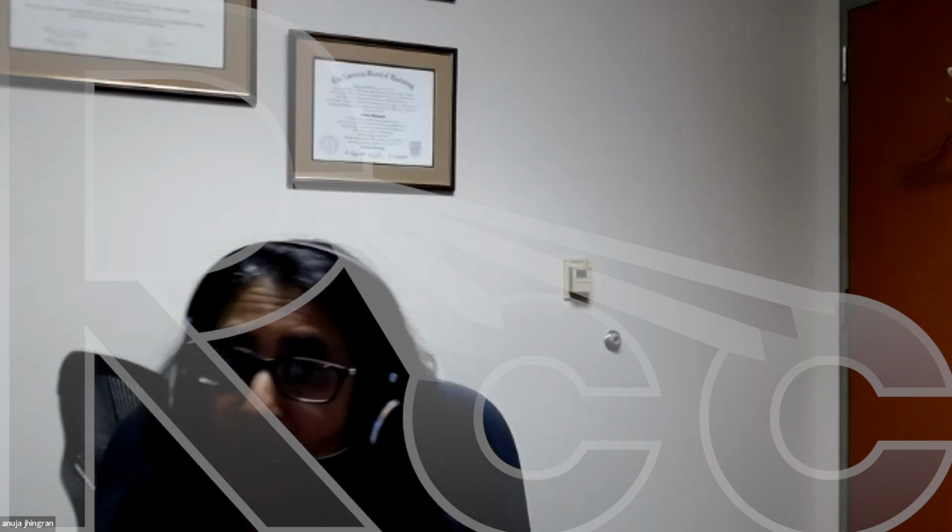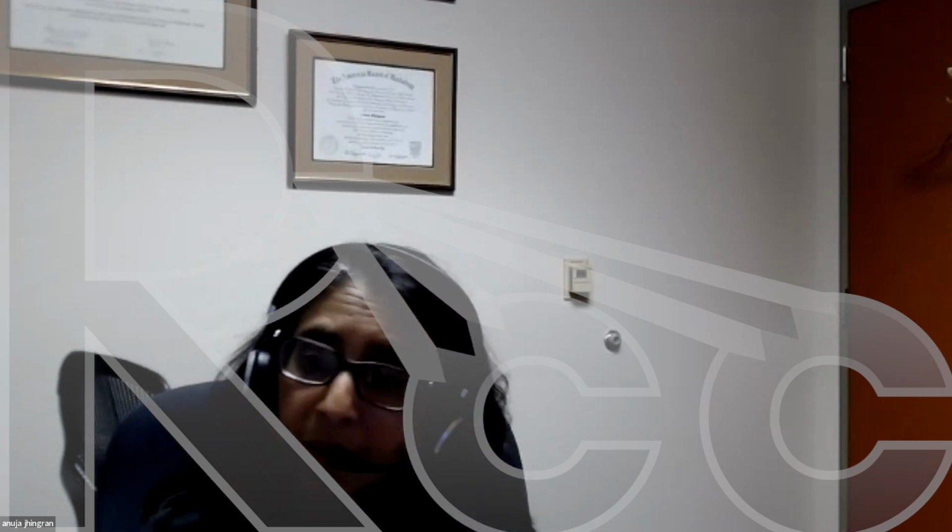We will start doing more frequent CBCTs in the 4th and 5th week when they have the diarrhea and they can't get their bladder full. So we may change it depending on the week. We usually start off with once a week, but we may change it to more depending on their symptoms.